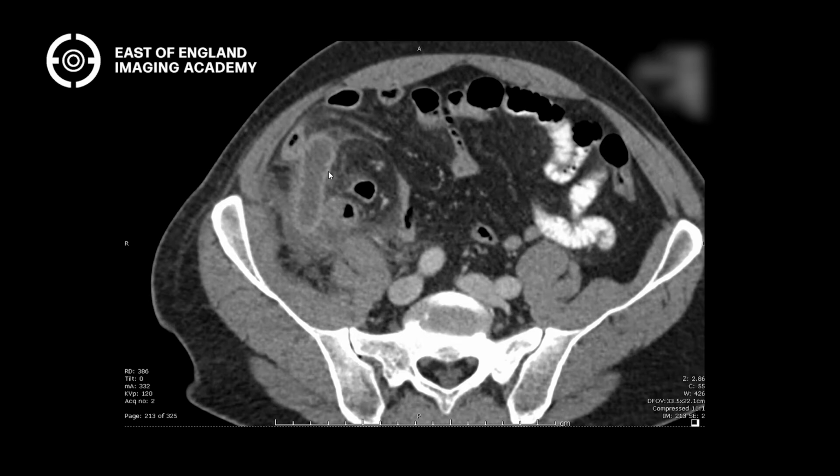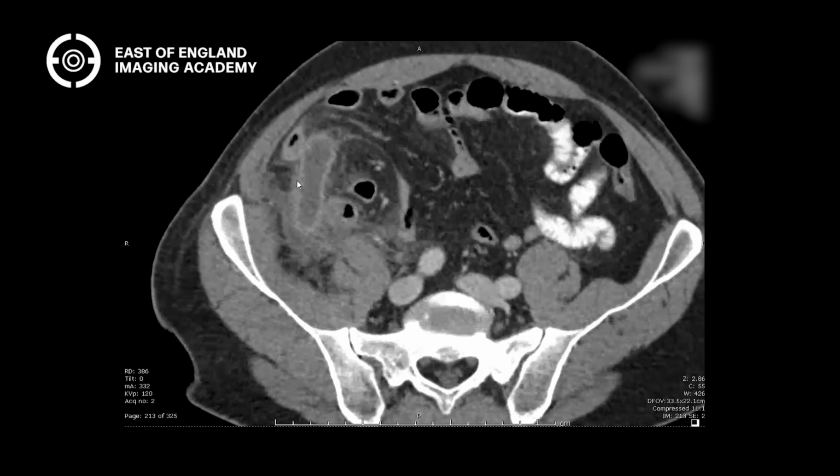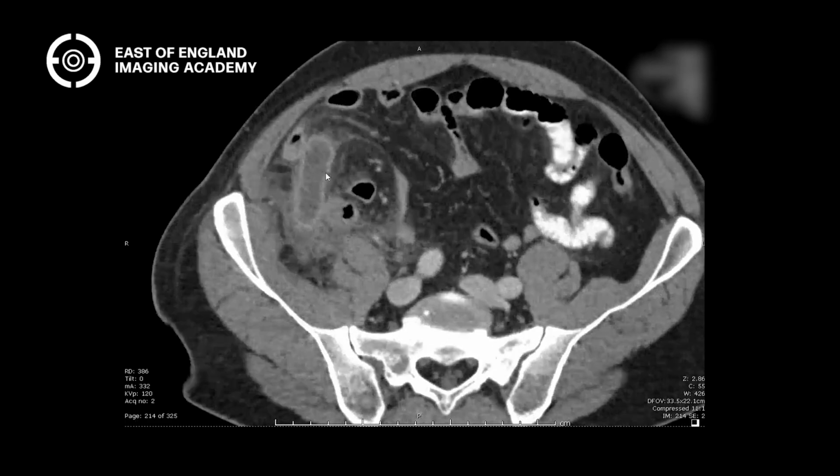But as a radiologist, you don't stop there. You take it further, okay? Take it one step further. Right, so it's an appendicitis. You can see the appendix is distended. You can see the wall of the appendix is minimally thickened, but it's enhancing quite a lot, isn't it? Compared to other loops of bowel, it's actually enhancing quite a lot. Why? Because inflammation leads to vasodilatation, which means more contrast and more blood gets to that organ. Does that make sense? So inflamed things generally tend to enhance more because you get more of the contrast.